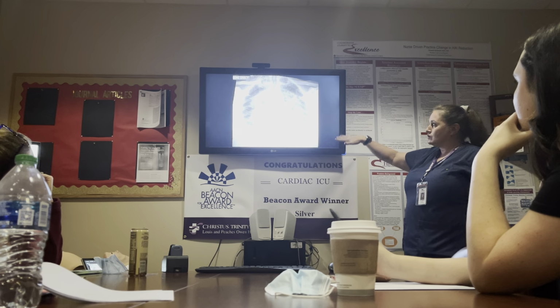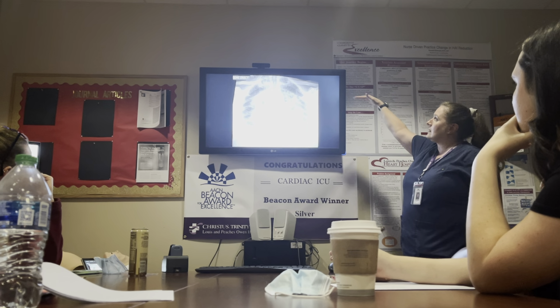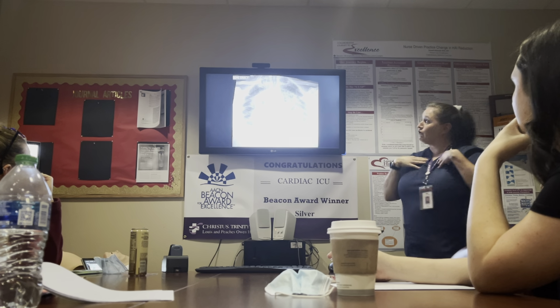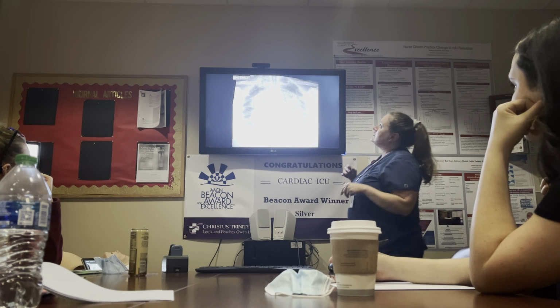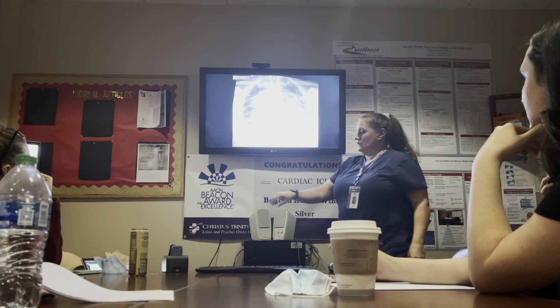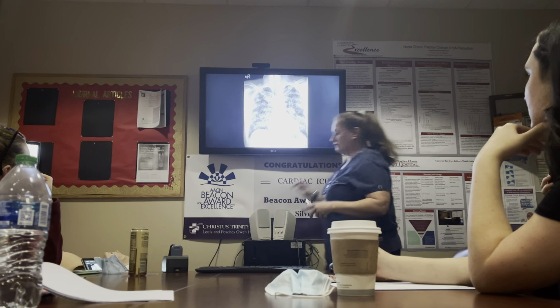When you look at it, it's a good film, reasonable. We don't have the apices as well. It's a little bit flattened with regards to the clavicles. The clavicles aren't as curved as they should be. So kind of sitting upright and probably back this direction. But what do you see different here that you didn't see in that previous film? And I'll go back one film, okay? Pretty diffuse, pretty involved.